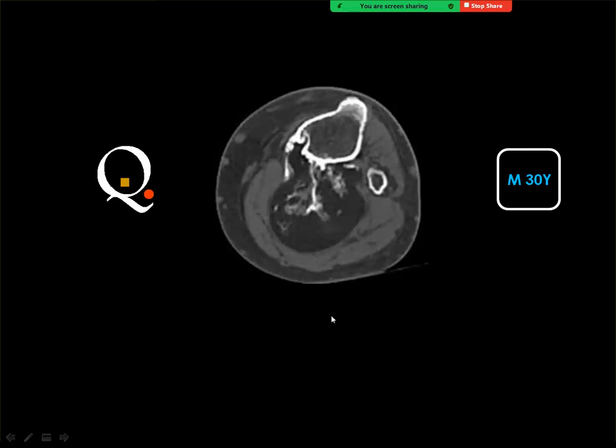You remember from the lectures of soft tissue tumors that paraosteal lipoma is a mass of fat tissue that is adherent to the bone, and because of its intimate relation to the cortex of the bone, it will initiate some sort of bone reaction, and this bone reaction will appear as bony strands going through the lipoma itself.